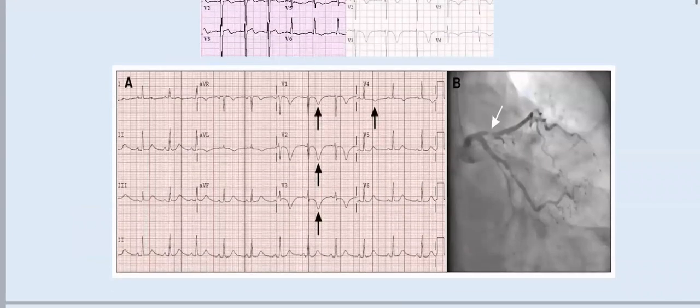You see this ECG, this is Wellens syndrome type B, which is more common. And the coronary angio of this patient has shown a significant proximal LAD disease. So Wellens syndrome is called proximal LAD syndrome. But the most important thing I remind you of is that when the patient has pain, his ECG is normal. When he is pain free, he has these changes. So ironic, okay? So this is the Wellens syndrome.